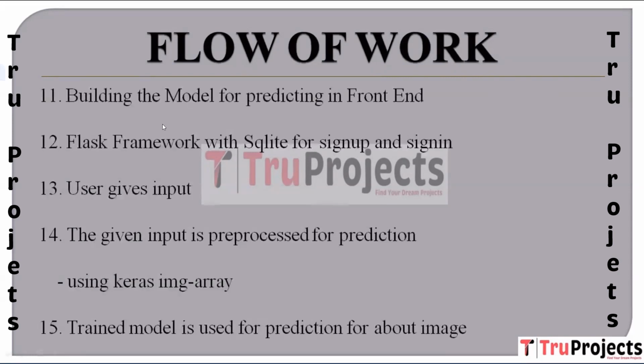Then we have here building the model for predicting in front end. So in this, train the deep learning models using the training dataset and evaluate their performance on the test data. In this, we have to develop the necessary components to use the trained model for predictions in a front-end application.